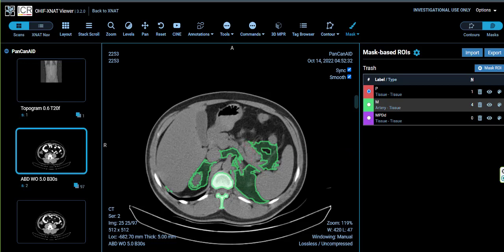Also, the last thing is that please make labels and images similar to each other. If the project coordinator said that you should have P as red, please do that. It would make things much easier for everyone.